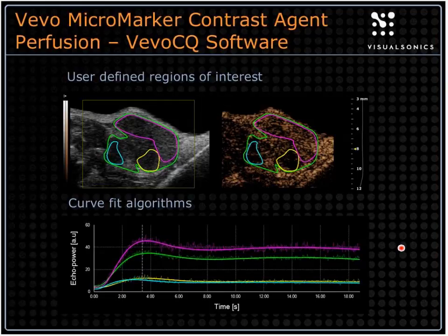If a clip is too short, say 5, 10, 15 seconds, there may not be enough time, depending on the tissue that you're looking at, for the level of signal to come up to that constant, that peak level before tailing off. So some of those parts of the modeling algorithms don't really apply. So the software will complain. It'll say you should have something longer.